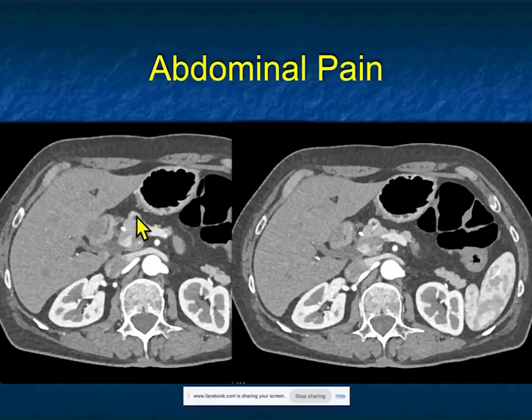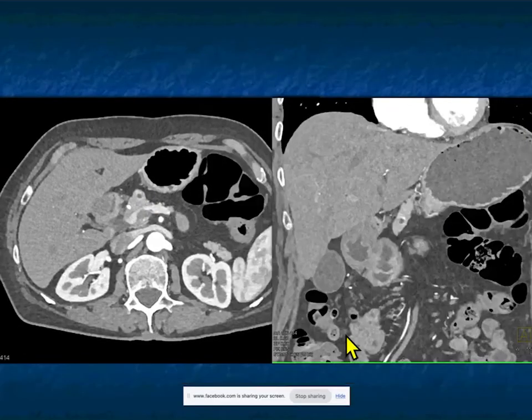And believe it or not, this actually measured a bit of fat. I don't know what that means, but here it is again. You can see it on the axials and coronal. Vascular lesion. Doesn't look like an IPMN. You don't get rim enhancement like that.